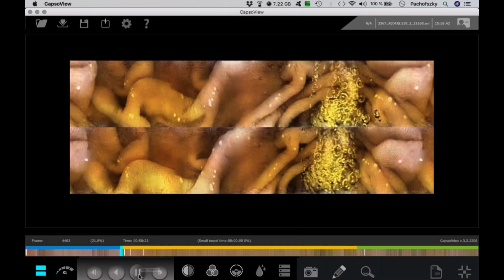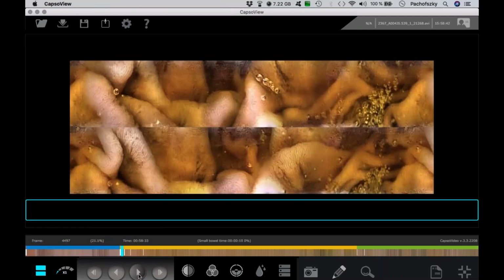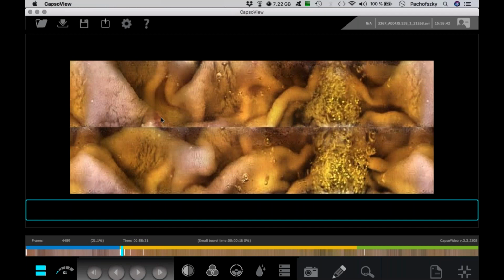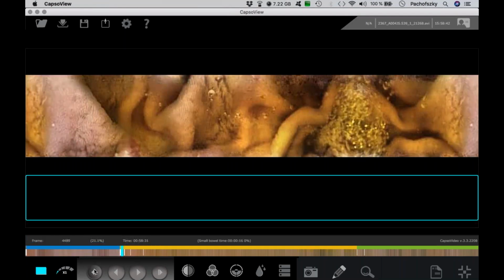And now it's the same like with other capsule systems. We have to go on and to mark all the lesions. I think for now I will go back to the panoramic view, because it's much easier for you to look with this view. I think it will be hard enough to look at a CapsoCam study, even you don't have seen a CapsoCam at the moment.